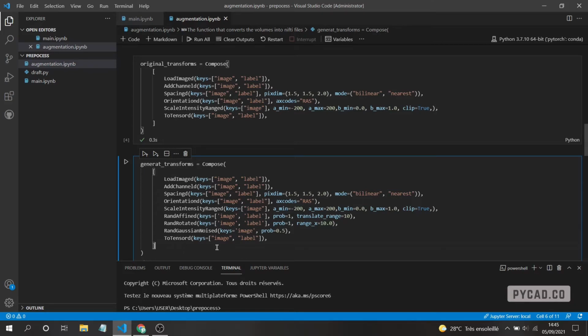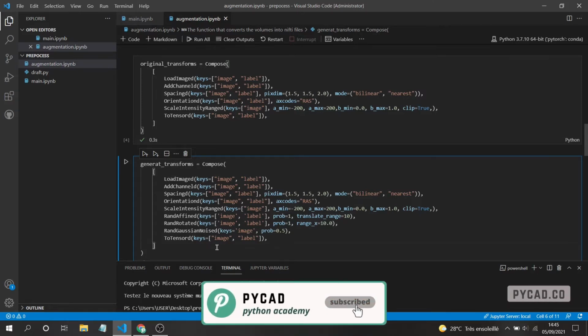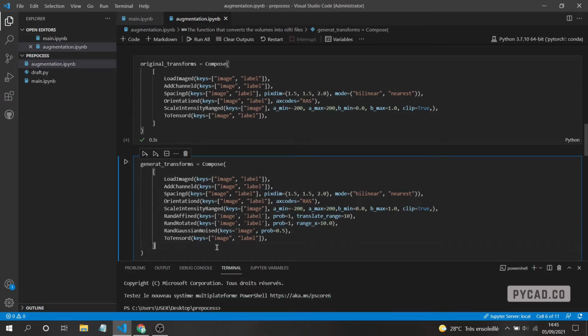And the third one is to generate synthetic patients, but you save them only in the RAM. So you create an array or something and save them, as you do when you use TensorFlow, because TensorFlow has a specific function where you specify only how many times you want to multiply your data, and it will generate them and save them in a tensor. There is no such function here, but you can create it by yourself. But this is the third way that I will not do in this video. So in this video I will talk only about the first two.